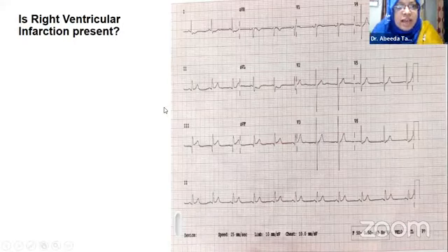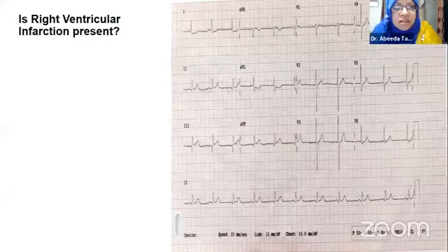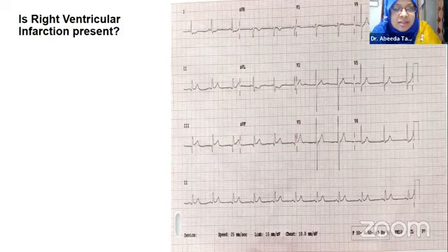So regarding that, I'd like to ask one question in this case. As we all know, in acute ST elevation MI inferior, there are 2 questions: whether there is a concomitant presence of RV infarction and also whether there is any posterior infarction. In this case, unfortunately, we missed both the right-sided and the posterior ECG. So is there any way that we can at least have some clue whether the patient has any right ventricular infarction, just looking at this left-sided ECG?